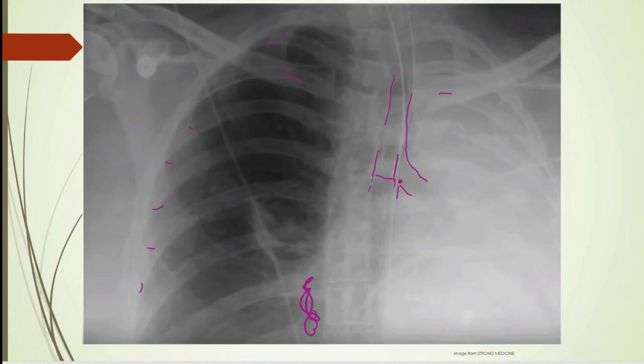And so, yeah, this patient needs that endotracheal tube pulled back really quickly. I'm surprised they couldn't pick this up clinically without having to pick it up on a chest x-ray. This is pretty bad, actually. I would say they need to hone their clinical skills a little bit.